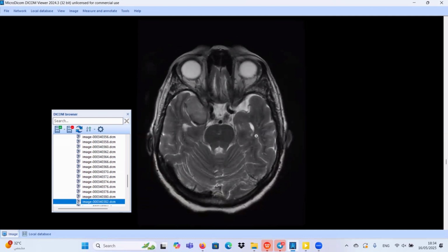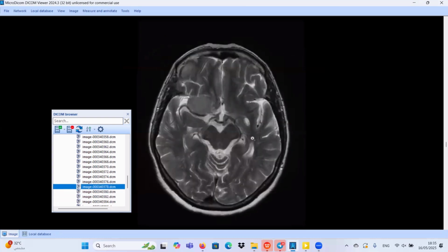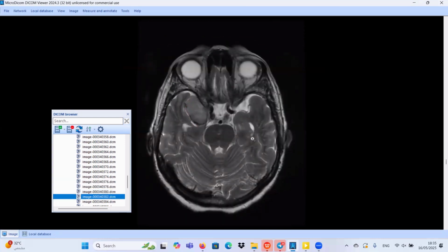very clear hyperintense rim of CSF signal. This is called the CSF cleft sign, indicating that we are dealing with an extra-axial space occupying lesion, and the lesion is seen surrounded by a rim of hypointense signal, reflecting calcifications. Also, the lesion is seen intimately related to the patent M1 segment of the right middle cerebral artery, very close to the cavernous portion of the right internal carotid artery.